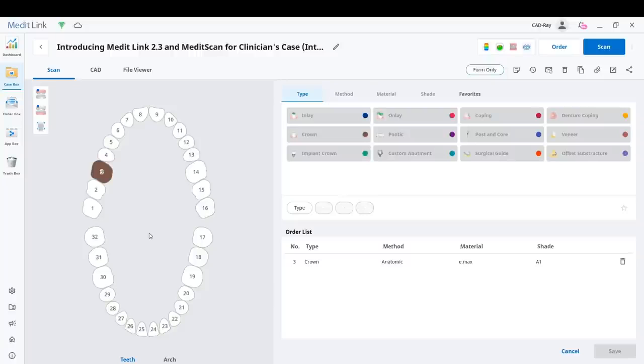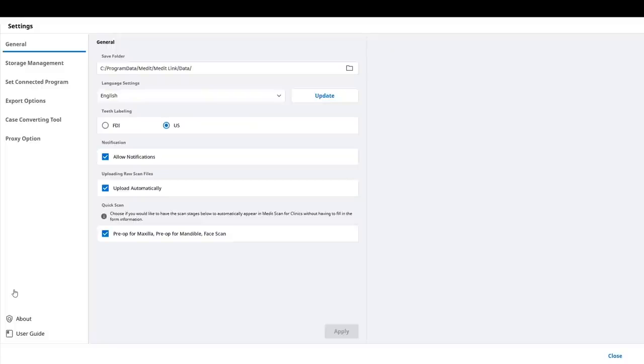Separate from that, a few things I want to show you that are great new features that have really propelled this software to the forefront of all the different imaging programs we have available to us. And that's namely how to attach CAD programs to this.